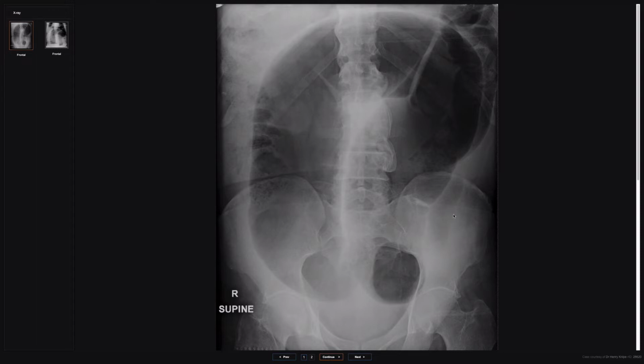Now, there are heaps of different radiographic signs that you'll come across talking about sigmoid volvulus, and there is a lot of overlapping appearances. The key thing is you have a single grossly distended gas-filled viscus which occupies much of the abdomen and pelvis. It may point to the right, it may point to the left, it may point just straight upwards. It varies. You may or may not see a convincing coffee bean sign. Not really seeing a convincing one here.